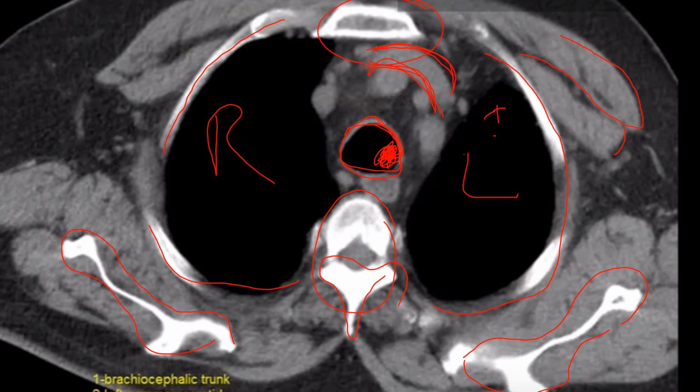Even though we identified our sternum and our spine, they're flipped, right? The left and right are flipped. And so this right lung is over here. So if we're going to see any coin lesions or anything like that, traditionally, those are in the right upper lobe with the three airway segments up there, the apical, posterior, and anterior segments. And so if you see something on the right side, which would be on the left on this, oh heavens, right? If you see a coin lesion up here, then that's something that we'd see when we go in to do a bronch procedure. That's probably an area that we would target.